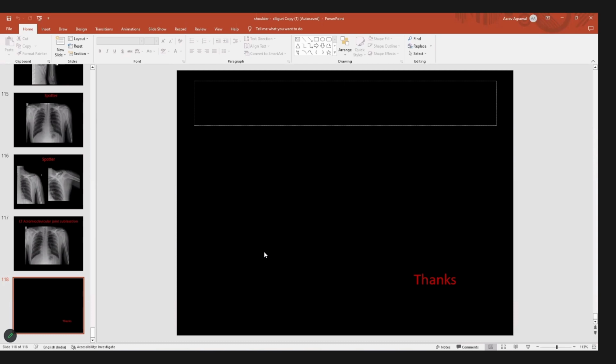So there is a question, Dr. Mitesh, from Smita B. The question is, do we have to specify subluxation or dislocation at the acromioclavicular joint? Okay, fine. If you are seeing a very obvious large step, meaning the clavicle is just not aligning with the acromial process, then it's better to use the word dislocation. Otherwise, if some contact is maintained, then we can use subluxation or dislocation. So in FRCR rapid, if it is really obvious, it is better to write dislocation.